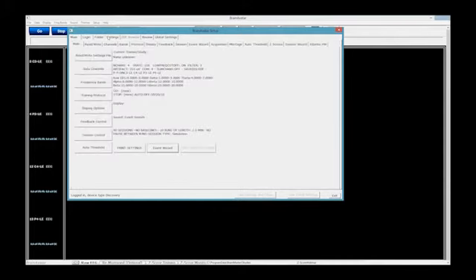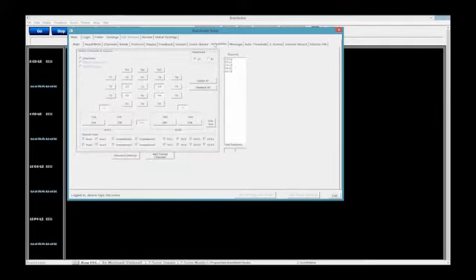So I'm going to go to my settings tab right here. The first place I want to go is the acquisition tab. This is where you say what you're acquiring, and what you're acquiring is going to be what you base your Z-score training off of. So, for example, if I wanted to stick with 4 channels and just move these C sites to F sites, that's fine. You can do that. But before you continue, you need to double check your Z-scores and make sure you're collecting the right Z-scores at this point in time.